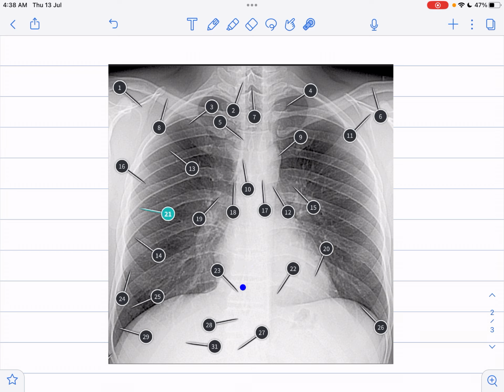And there is a very good trick to know, if you guys cannot count these very clearly, sometimes the x-ray is not that clear. So if you cannot count it, just see these linings, the hemidiaphragm. These are actually at the level of 10, so this is going to be the 10th thoracic vertebra. Simple, this is going to be the 11th thoracic vertebra, and this is the 12th thoracic vertebra. Really simple. So we just counted the vertebrae. Very easy.